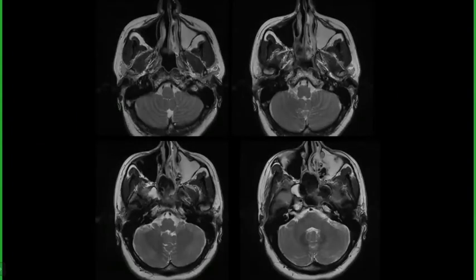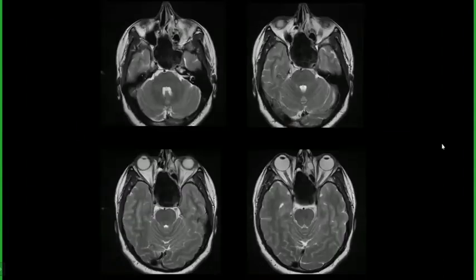You can also see a T2 bright opacification of the maxillary sinus. Can you use the pointer and show the lesion? This is the T2 hypointense lesion involving the entire sphenoid sinus, causing expansion of the sphenoid sinus. It is extending anteriorly into the ethmoid. Why do you say this lesion is in the sphenoid sinus? Why not in the sellar region? How will you differentiate a sellar lesion from a sphenoid sinus lesion?